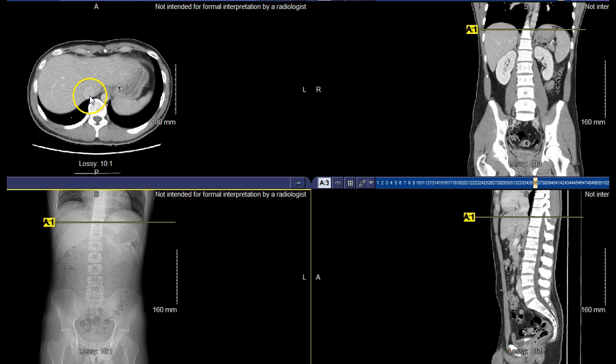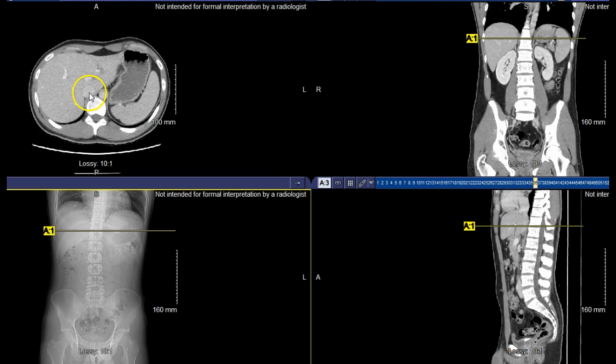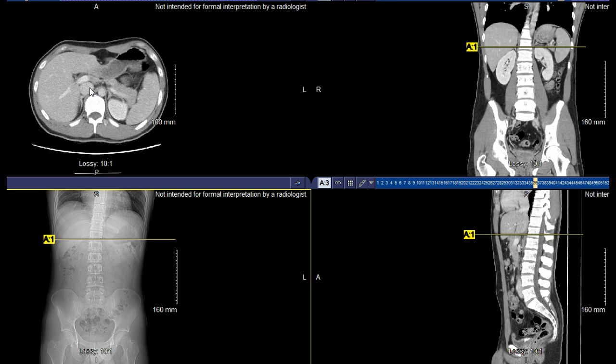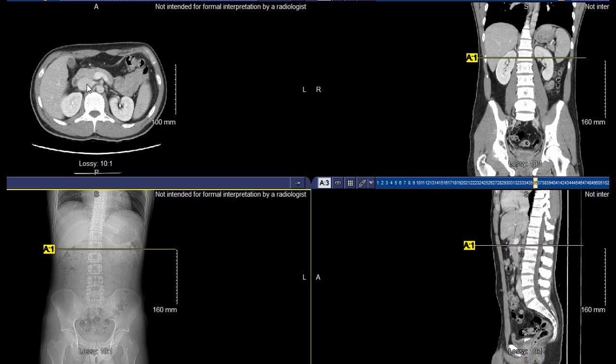It becomes nice and clear. As we continue to go in, it's starting to blur in with some of the contrasted structures of the liver. But nonetheless, you can still see that circular-based region as we continue to go down. Additional structures that I wanted to emphasize going forward: I wanted you to be able to see how that divides off and articulates with the renal vessels.